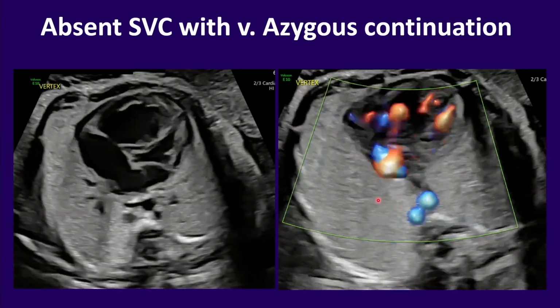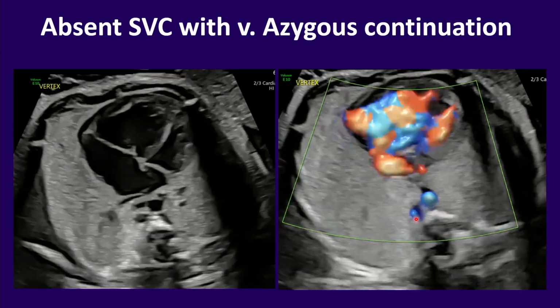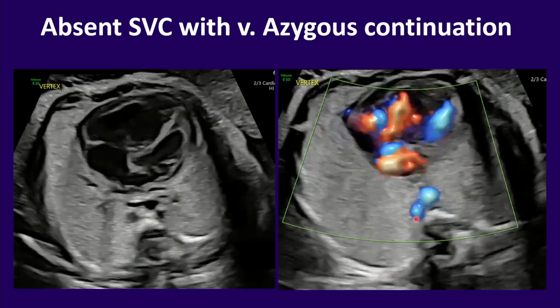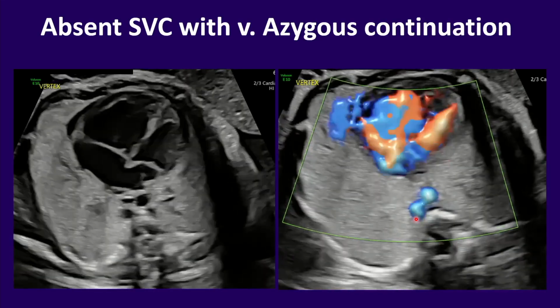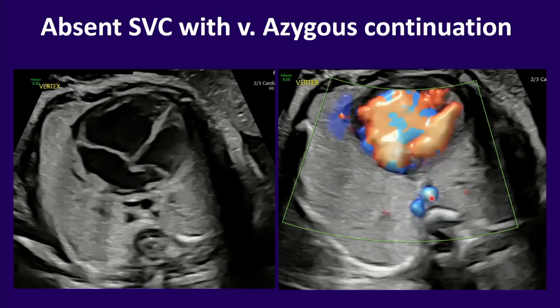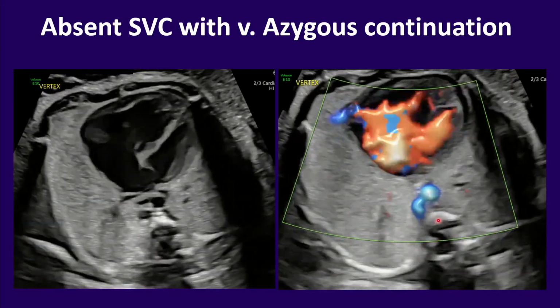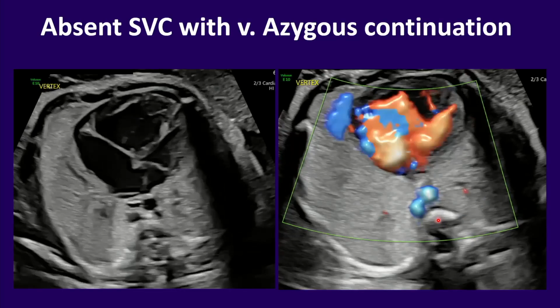And I just want to highlight that the direction of the blood flow, if it's an interrupted IVC, is going to be the opposite, because the dilated azygos vein brings the blood up, and the direction of the blood flow in the aorta would be down. So here we have the direction the same, and that was very diagnostic.